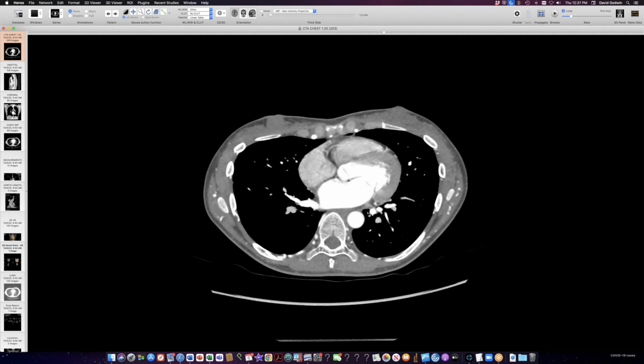And then here's that very high degree of stenosis of the aorta. It's really almost lost in this area. Really impressive. Okay. Well, that's all I've got assembled this week, Travis.